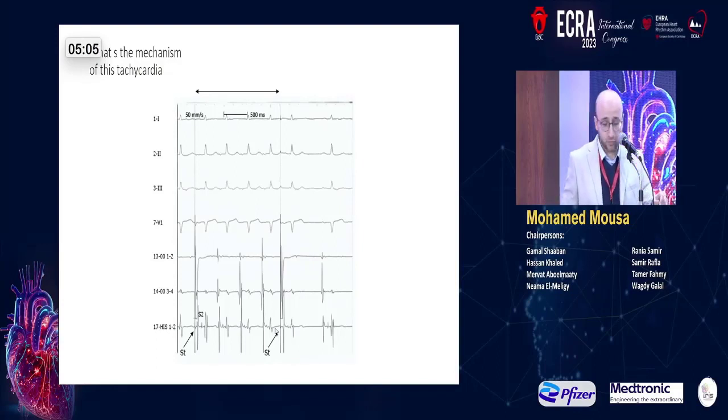Reentrant. Atrial tachycardia is very rarely reentrant, but in this case they ablated the atrial tachycardia at the site of earliest atrial activation preceding the P wave. Was the stimulus capturing? Yes, it was capturing. Some events can stop on their own while you are delivering an extra stimulus, so you have to make sure that what you are doing is effective and not by chance.